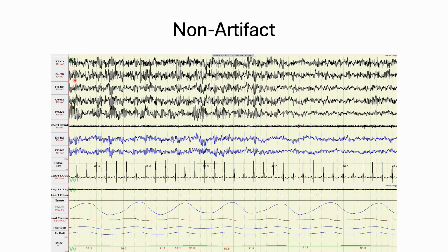So the EEG is very clean. These aren't very thick lines. You can see individual waves happening. This person is falling asleep. Lots of big, nice alpha. And then right here it starts to attenuate, and you can start to see little waves. You've also got some slow rolling eye movements.